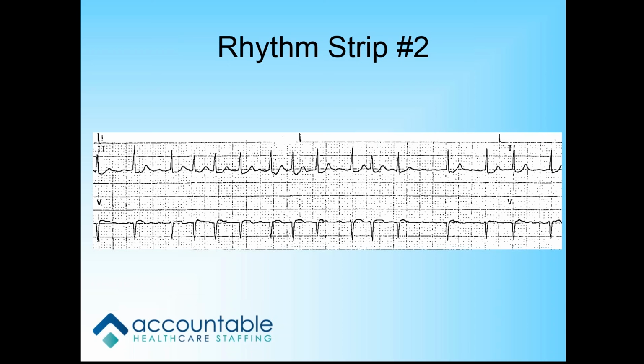Okay, let's take a look at this rhythm strip. First, what's the rate? Fast. It's fast, right? But how fast is it? Because that's the key to what you're going to be doing for this. That would be 140. Yep, 130, 140. So it's too fast, right? Yep.